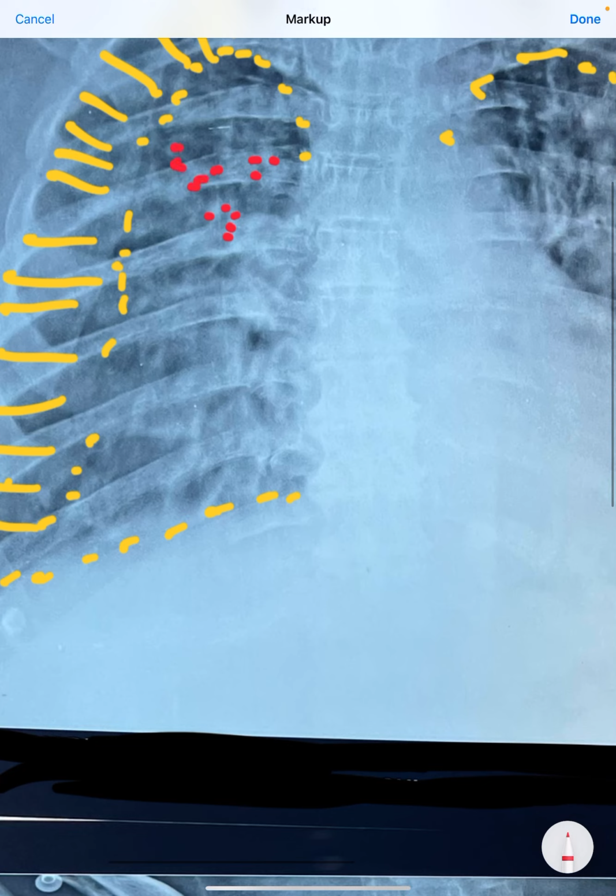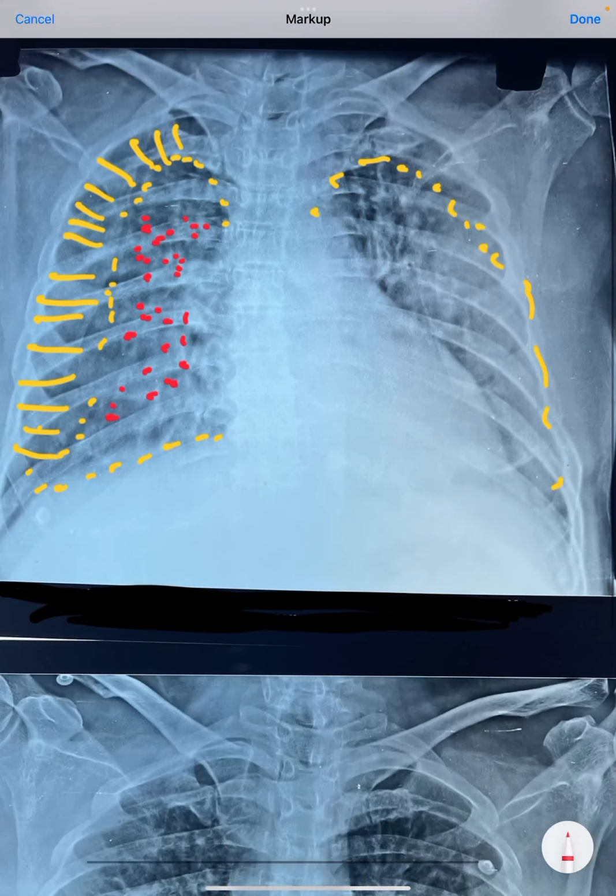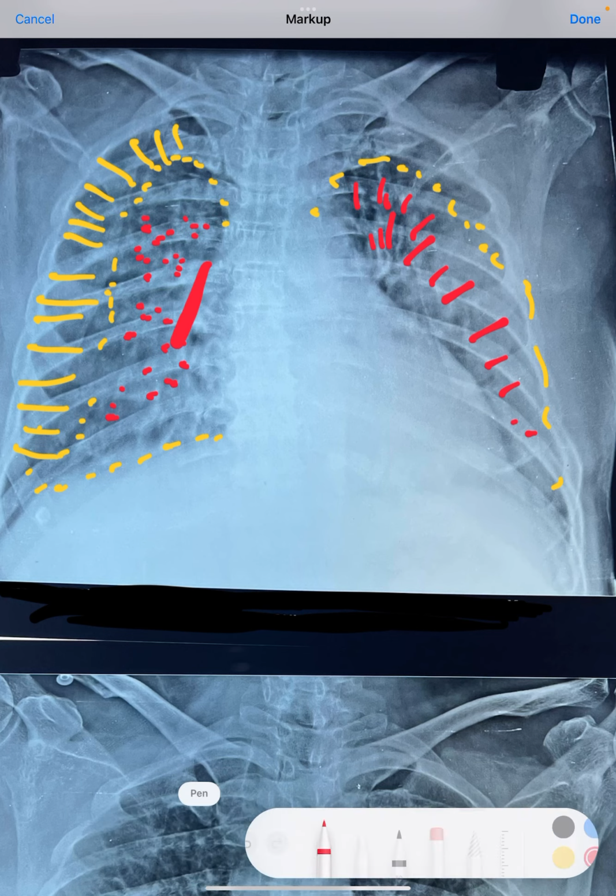We can very easily and very nicely see that there is infiltration or opacity in a reticular pattern. There are some white linings which we can see here. This is very much present only in a much denser form around the hilum region only.